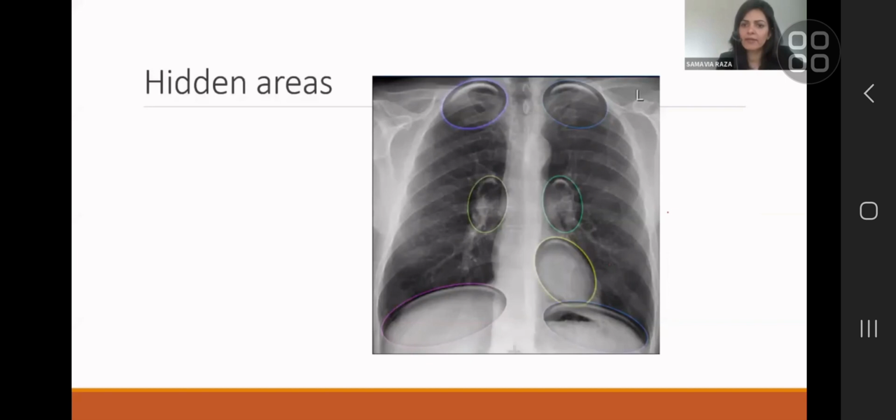If the density is a little bit high and you have a previous imaging, like I said, the best friend for somebody reporting a chest x-ray is the previous film. Look back 6 months ago, a year ago, it looked almost the same, or a year ago there was infection there and they have evolved into that. You can discount it, but it's important to describe it.